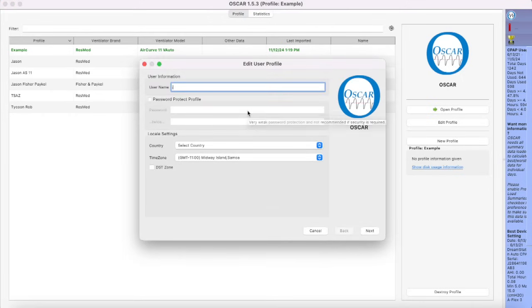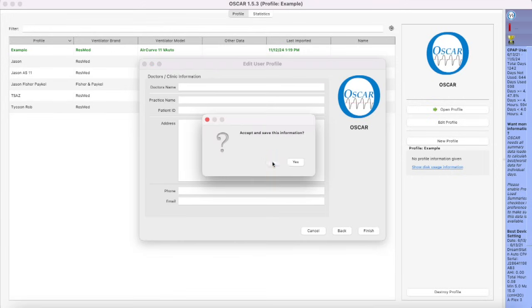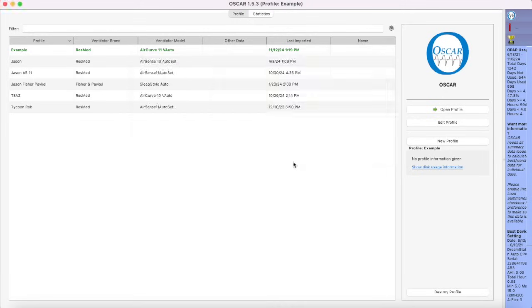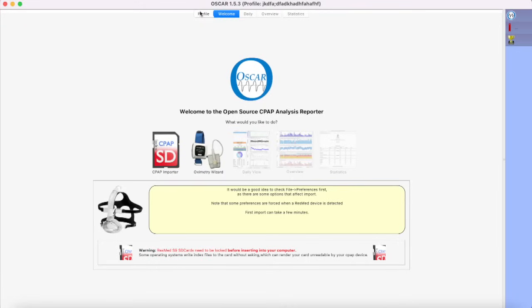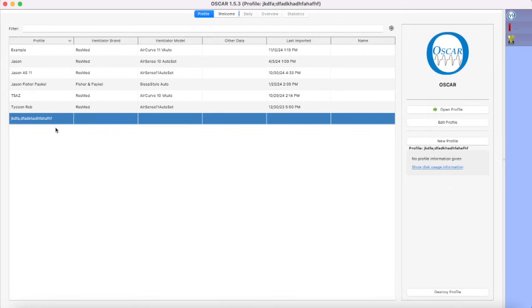So you just put in whatever you wanna title it, hit next, next, next, finish. You wanna accept and save, and I just said no, that was stupid. So next, finish. You wanna save this? Yes, I totally do. So if we go back to this profile page, we're gonna see this is the one I just opened. There's nothing downloaded in here. So what we have to do is open that profile. Remember, this is gonna be your new profile.